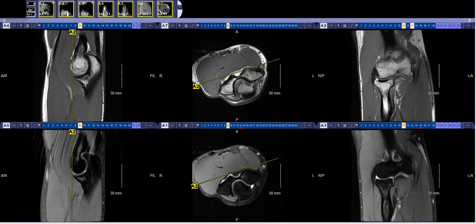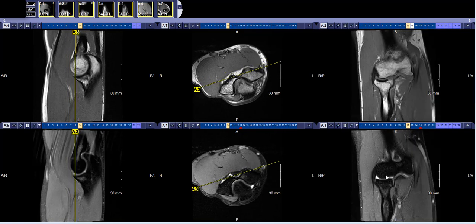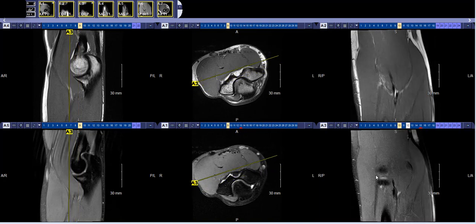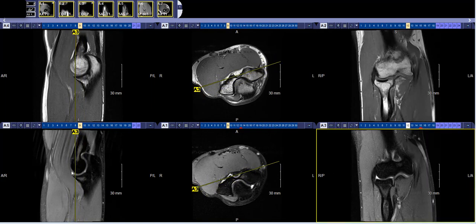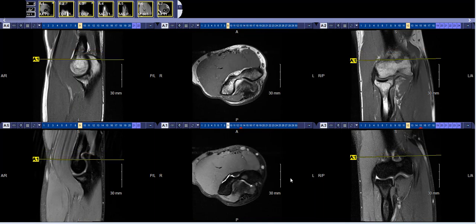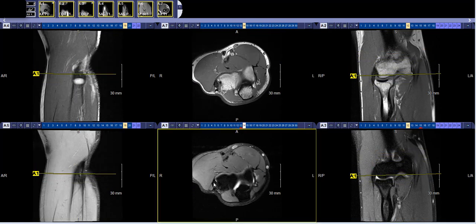So I continue on after that to look at more tendon anatomy in the elbow is how I do my search pattern. So I'll look at the common extensor tendon origin, lateral elbow here on our coronal sequences, looking for pathology there, often called lateral epicondylitis or tennis elbow. Tears of the tendon typically start anteriorly, but I'll look at the coronal. And I certainly will look at the axial, help characterize any pathology or tear, as well as the sagittal can certainly be helpful as well.